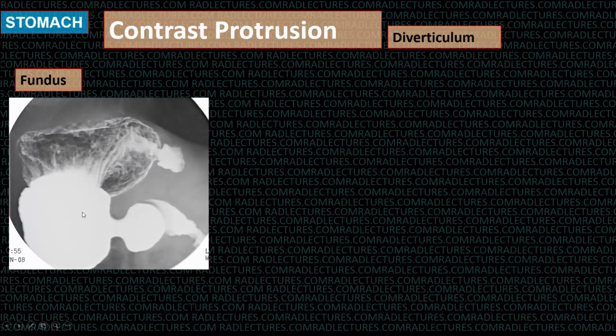I have not seen a diverticulum elsewhere in the stomach. Yeah, you can see them in the duodenum, but not gastric diverticula. You see it only in the fundus. It looks like a typical diverticulum. This is not the place for a peptic ulcer, so I wouldn't worry that this could be an ulcer. Ulcers occur in the body and antrum of the stomach. The fundus is protected.